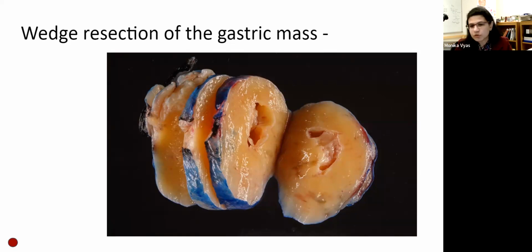Other differentials would include, I'm sure Matt would know more about this, soft tissue tumors, but it could be a lipomatous tumor if it was some other area. Neuroendocrine would be another differential to consider in cases with this morphology.